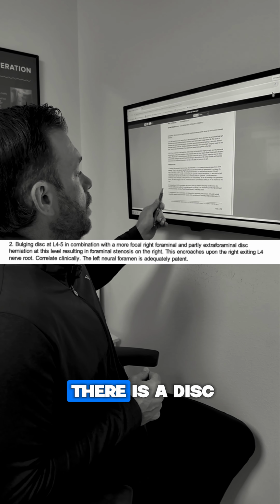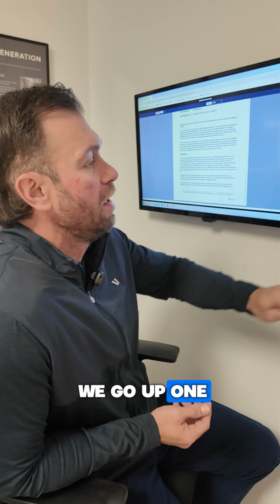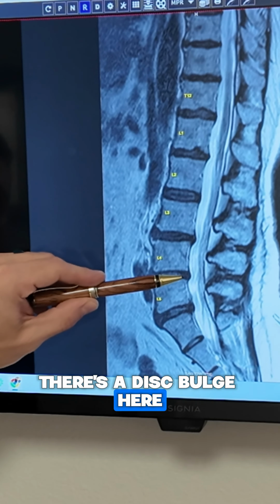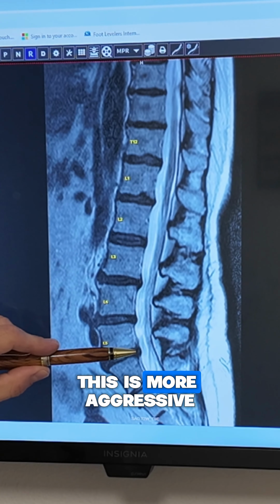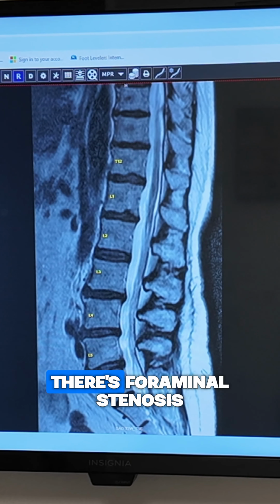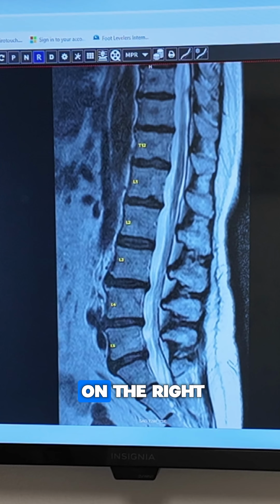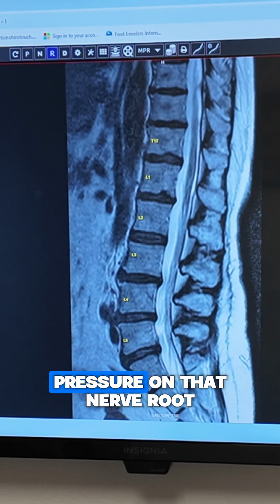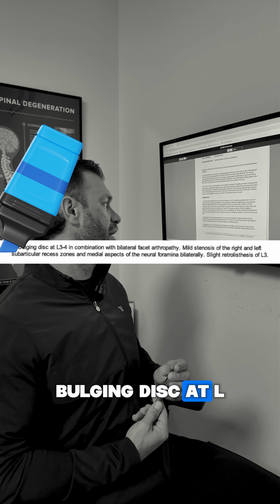Number two is that there is a disc bulge at L4, L5. If we go up one level from L5 to L4, there's a disc bulge here. What's the difference? They say that this is extruded, which is more aggressive than this disc bulge at L4. It also says that there's foraminal stenosis on the right side. That means the canal for the spinal nerve root on the right is closing and putting pressure on that nerve root.